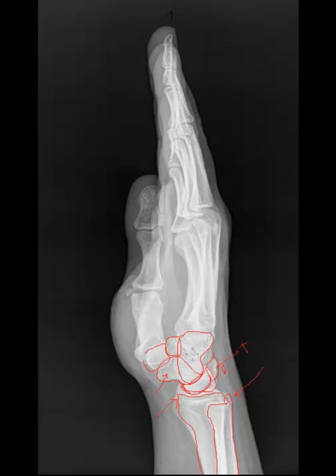We don't see the pisiform very well. We don't see the hamate very well, and so you have to use your other radiographic projections to help you identify those structures. Now, as you can see, all the digits as well as all of the metacarpals are stacked on top of each other. So this is not a great view to see them individually. However, with any type of forward or backward displacement or angulation of fractures, this view can be very useful to evaluate direction. Also, if you're concerned about volar plate or dorsal plate fractures of the phalanxes, this also is useful. You can also separate the fingers while taking this view and kind of fan them out so you can see the digits individually in a lateral perspective as well.